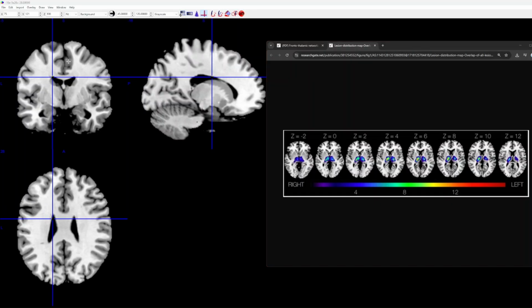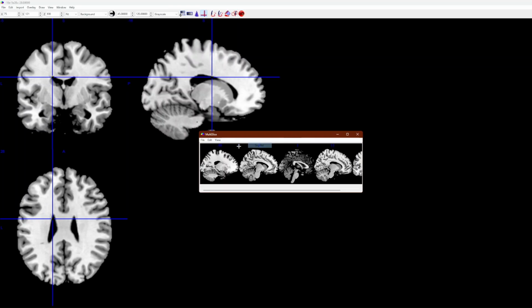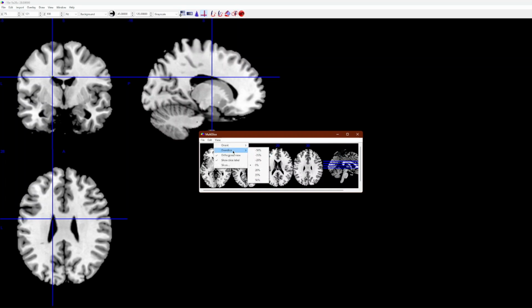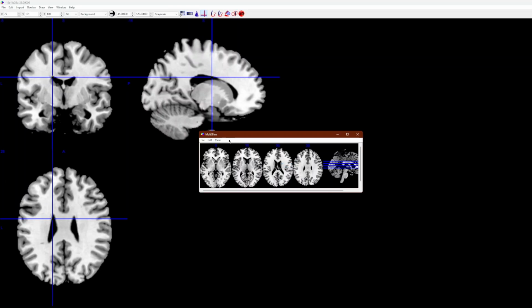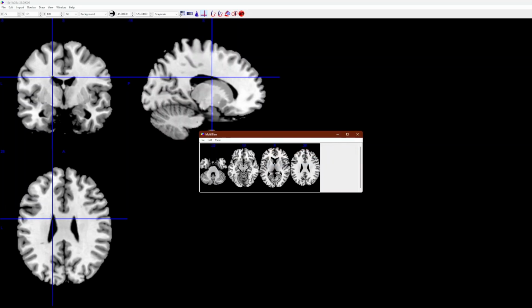After pressing multi-slice, we can specifically go File, View. We can orient it sagittal only, or coronal. Usually axial is the most useful, but it depends. You can oversample, you can cut. Overlap slices to make them closer together. You can change the orthogonal view, remove that. You can change the slice numbers to like 40. Let's say we can do 20, 40, 60, 80, 100. You can change these views as well.